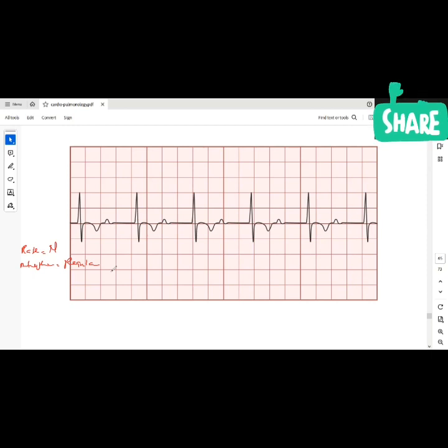As soon as after that inverted T, you see the P wave. Good. So P, QRS, good. All the QRS complexes have a P wave and all the QRS complexes are followed by T. Good. So the rhythm is what? Regular and sinus. Okay, what do you check next?